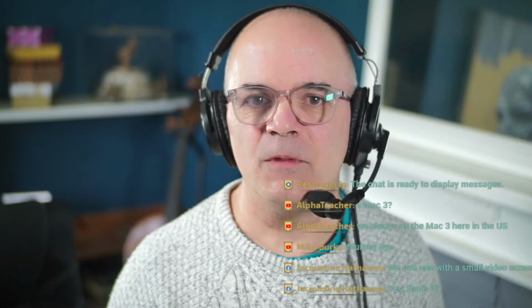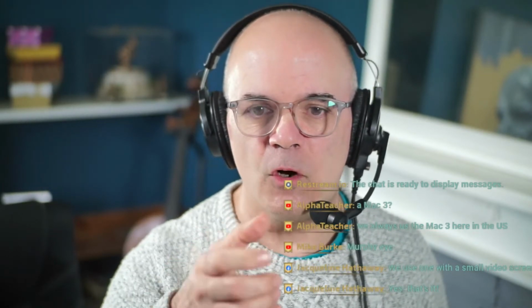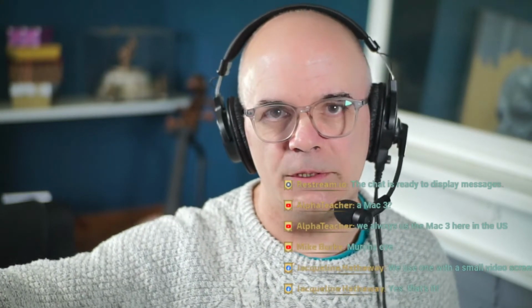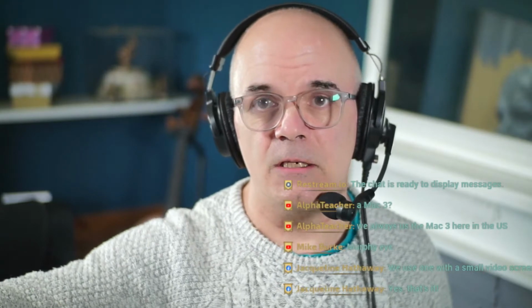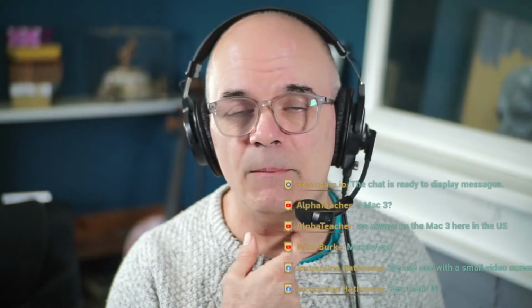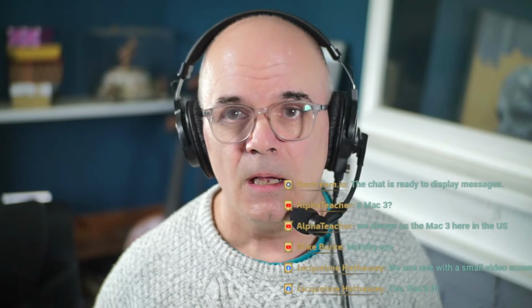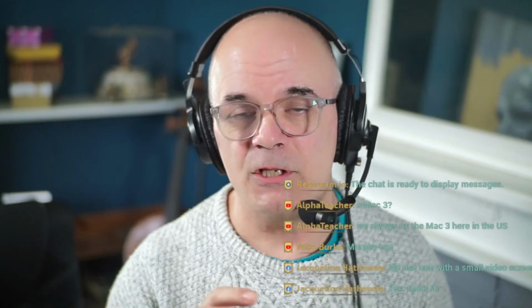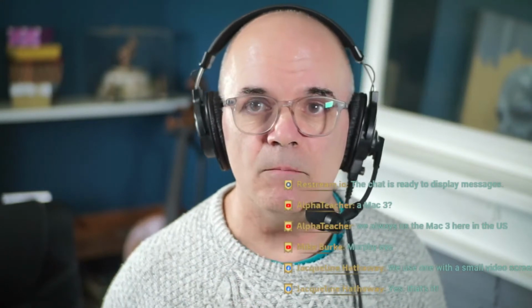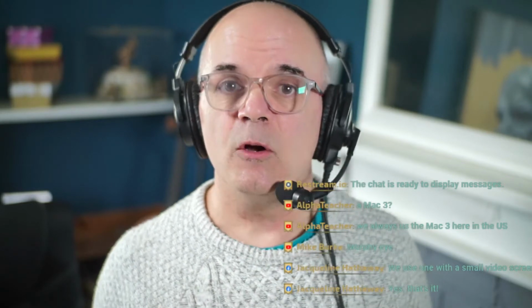I love the McGrath. There's something we use called the CMAC as well. Now the CMAC is slightly different in that you've got the handle, but the screen via a fibre optic scope is off to one side, so it's great for teaching because everybody can see what you're looking at. And it's also useful if you're a little less experienced and you've got your consultant, or your attending in America, behind you and they can give you some guidance, perhaps come out a little bit, go in a little bit, pull forward a bit more, perhaps a bit of pressure on the cords might help. So I hope that's useful.